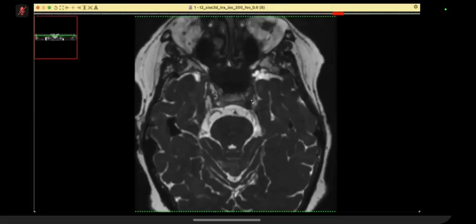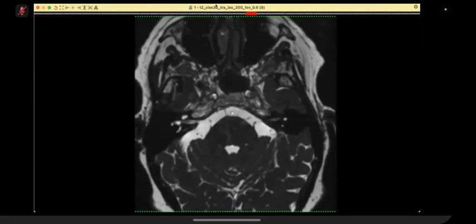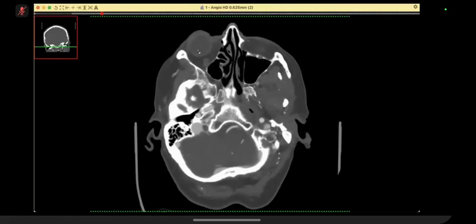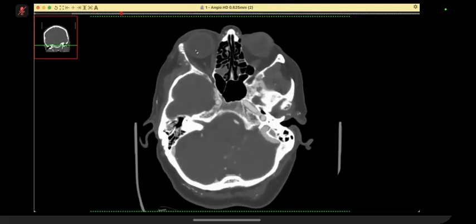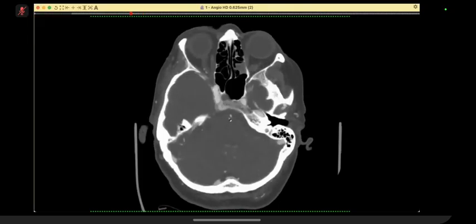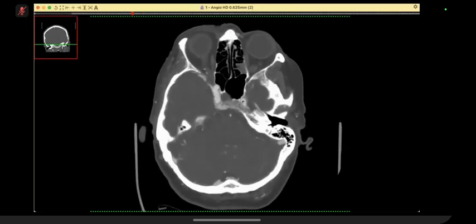And there is something happening here. So at this point, it is justified to ask for the next. This case, of course, would be very well seen on an MRA also, but CTA is much better than MRA. And this is the basilar artery. You can see how this artery arises, goes, and then is connected here.